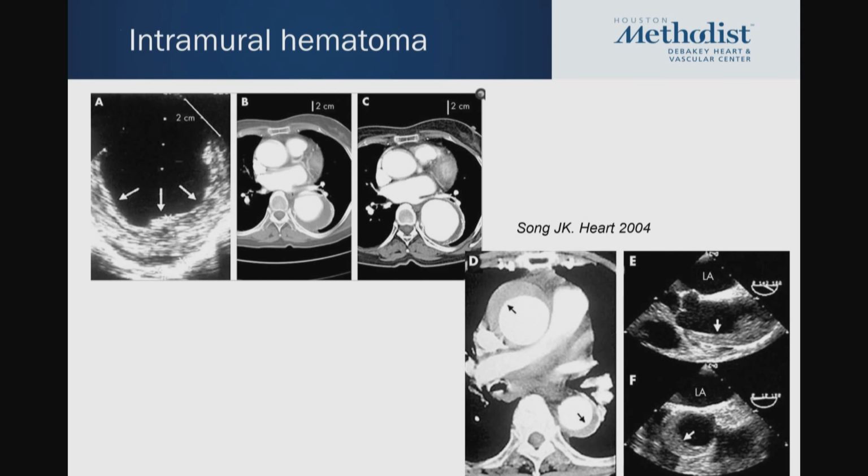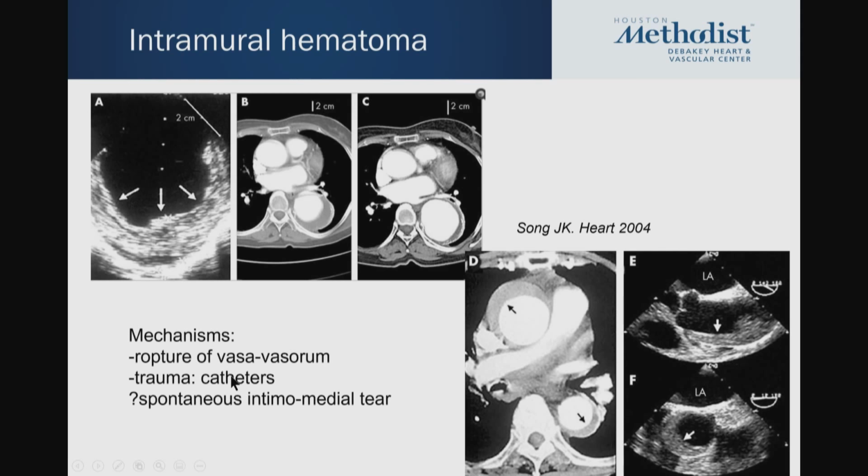Intramural hematomas, just as Faisal showed you, this crescent appearance of a very thickened aortic wall because of the thrombus there that we can see by CT is exactly what we see by echo. So if you were doing a TEE, you would be seeing the same thing. Now, the problem is, if it's a small localized hematoma, particularly in that blind spot, it could sometimes be missed. But the appearance is very similar to the appearance by CT.